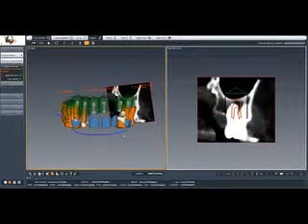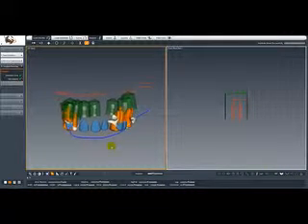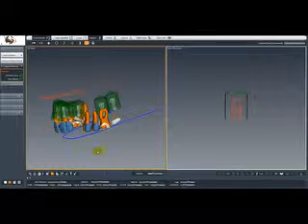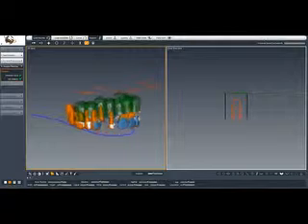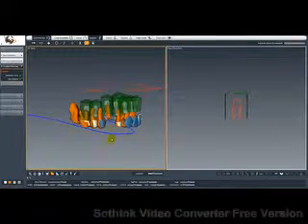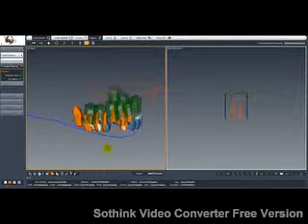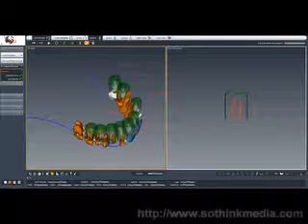So here are my final recommendations for this case. Looking at the left side, as you could see, we will need to place implants on tooth number 9, number 11, number 14, and number 15. Those are the only spots where we could place implants. Going to the right side, it's ideal to place implants on tooth number 3, number 4, number 6, and number 8. We will not be placing an implant on number 7, and we cannot place an implant on tooth number 2 simply because there are wide roots that are fused in the middle.